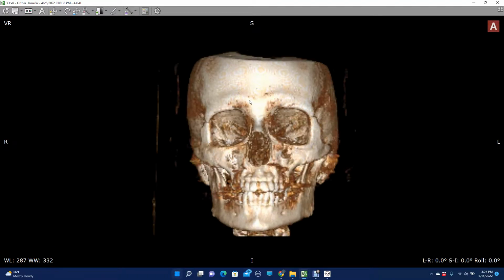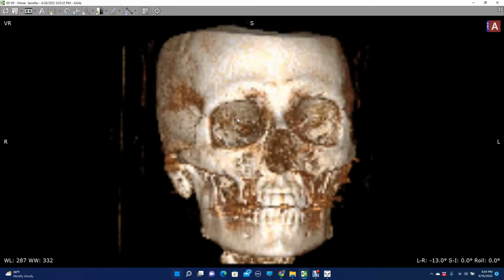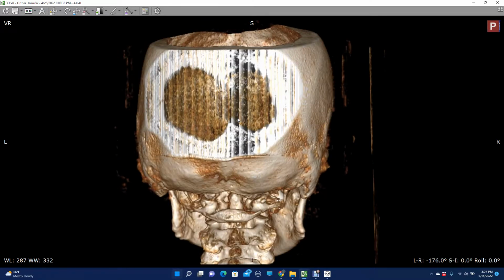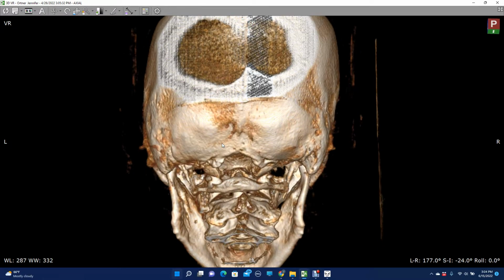To quickly show you how we do this, we're going to see where the skull looks most roughly unrotated. Right there for her at -3 degrees of rotation, she's not rotated, which means at 177 degrees, she'll be getting a straight posterior to anterior view of her. That is a straight PA view at 177. So I'm going to rotate this image with the arrow keys until I'm looking at more of my plane line. And so now the atlas is superimposed there.